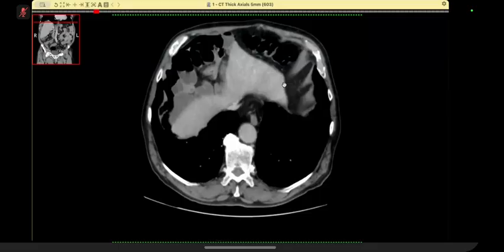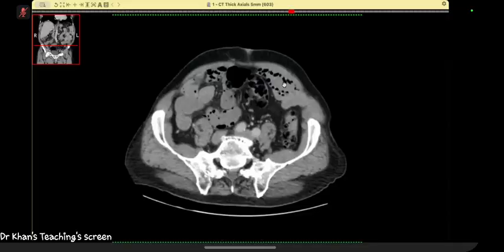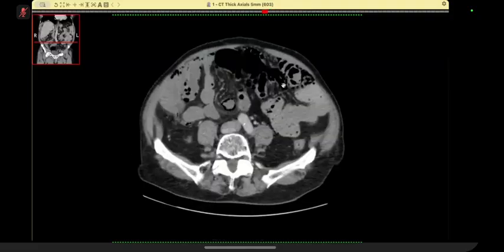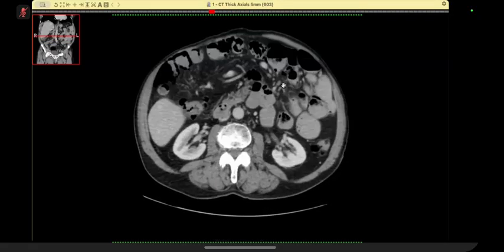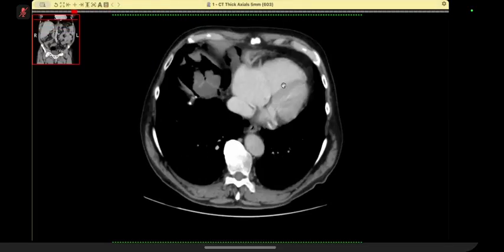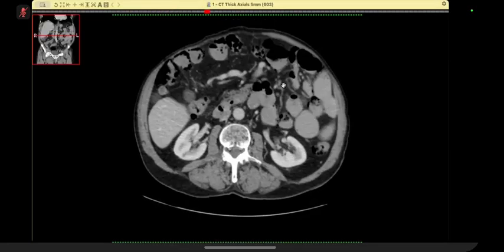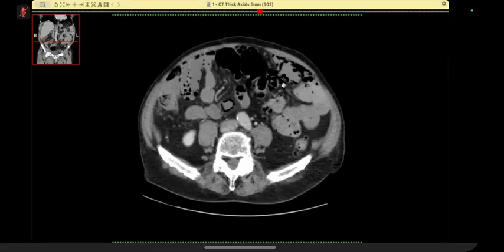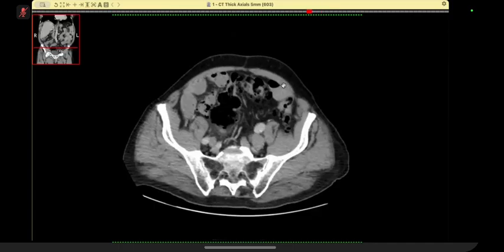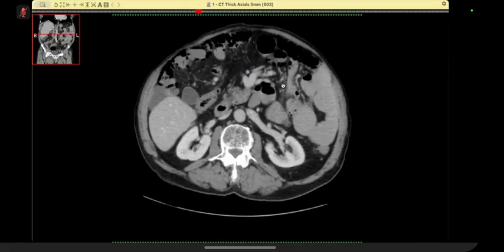So I would like to convey my findings to the referring physician. I could not establish any frank bowel perforation in this case. Further, I would like to see any other views available to check any bowel pathology which might be causing this. Other than that, I could not identify any other thing in this CT scan. I would also like to ask about the condition of the patient. If the patient is not that sick, then most likely this is the only problem he's having.